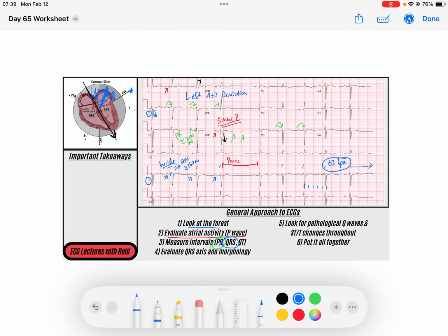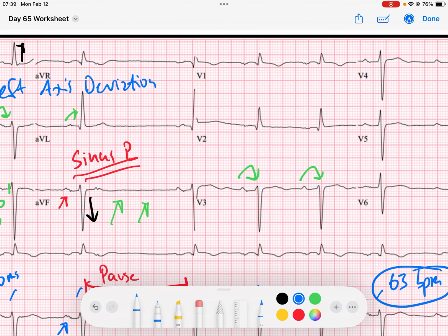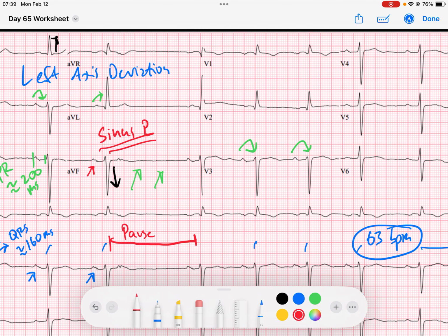What could cause that? Well, we know maybe left ventricular hypertrophy would be kind of a rare cause. I don't see any evidence of left ventricular hypertrophy. And so let's look for conduction disturbance, conduction blocks. The first thing I notice, which is interesting and doesn't line up with left axis deviation, is in V1 and V2, I've got this R prime, right? I've kind of got these late signals in the ventricle. That's a late R prime. I'd call this an R prime.